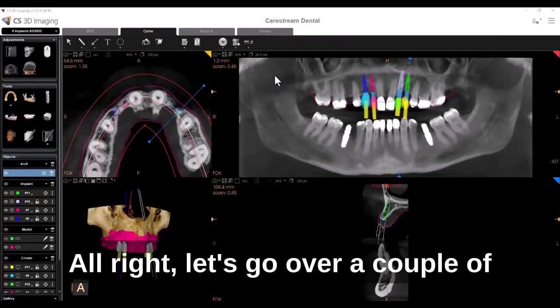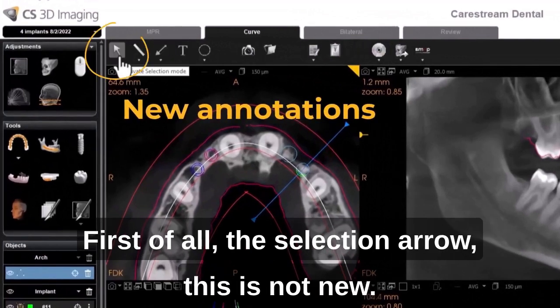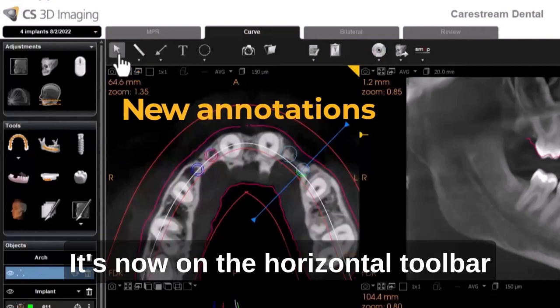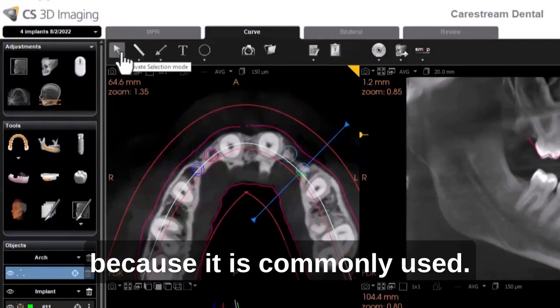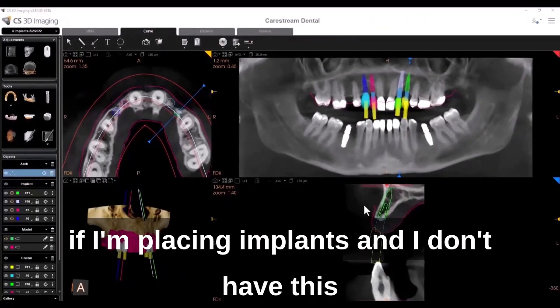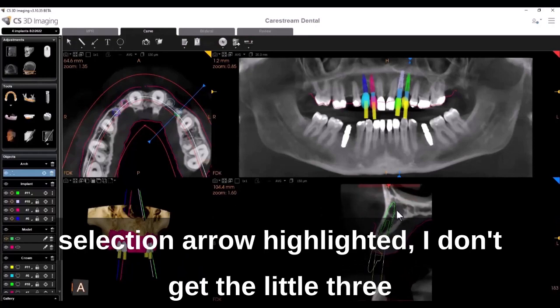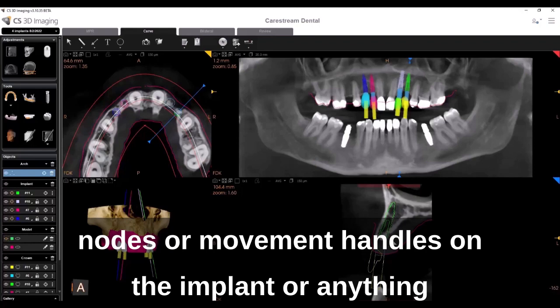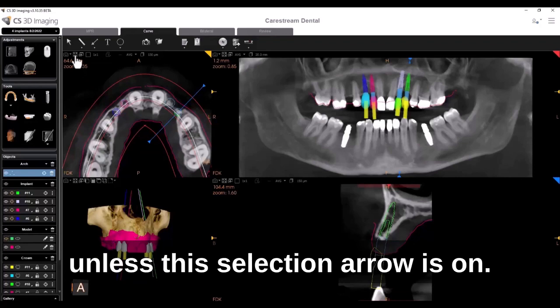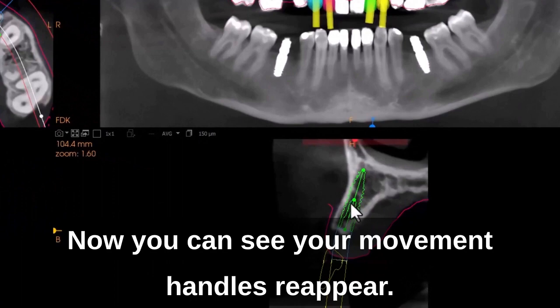All right, let's go over a couple of the new features in the horizontal toolbar. First of all, the selection arrow. This is not new. It was formerly on the left-hand side of the screen. It's now on the horizontal toolbar because it is commonly used. And just so you're aware of what it does, if I'm placing implants and I don't have this selection arrow highlighted, I don't get the little 3 nodes or movement handles on the implant, or anything that you can grab and move. You won't be able to do it unless this selection arrow is on. Now you can see your movement handles reappear.